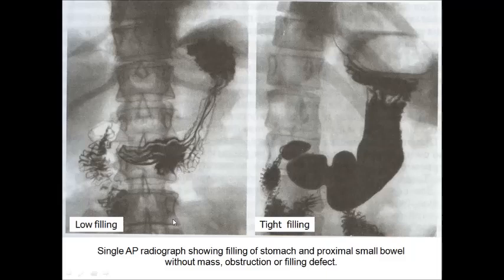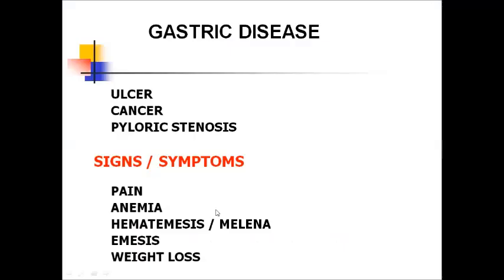On these two X-ray films, the image of stomach is without mass, obstruction or filling defects.